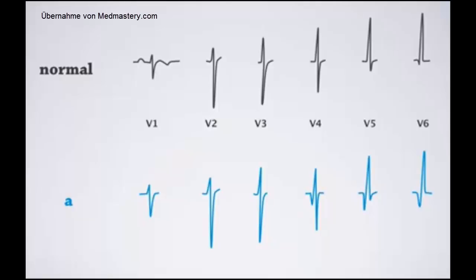Have you taken the time to think about it? Good. As you might have realized, there are Q waves in this ECG where there shouldn't be any, or at least they should look differently. They should be smaller, plus they should increase in size.